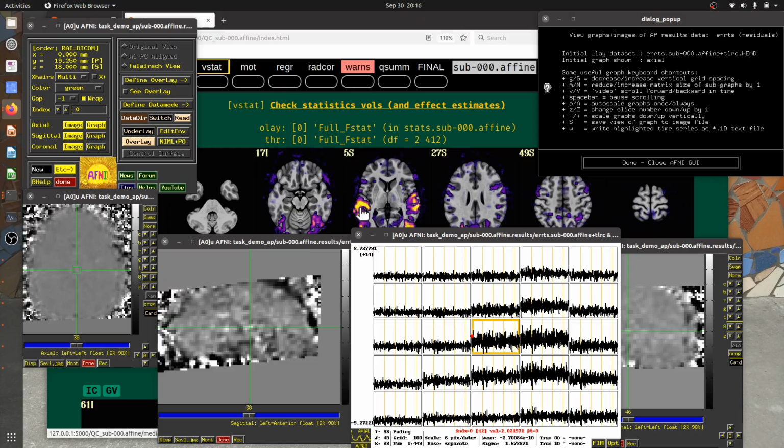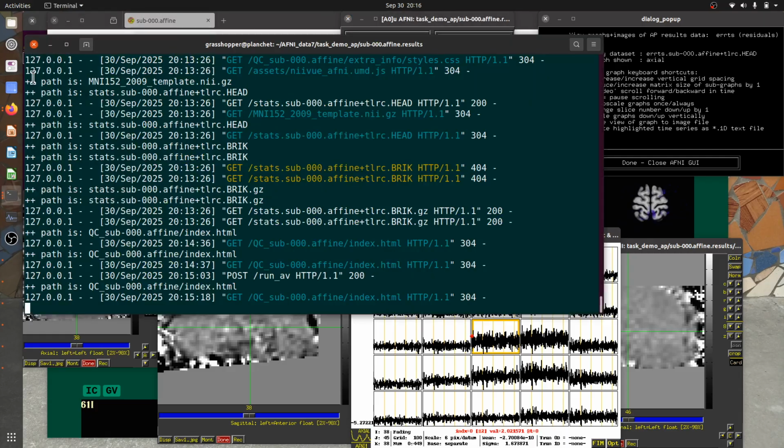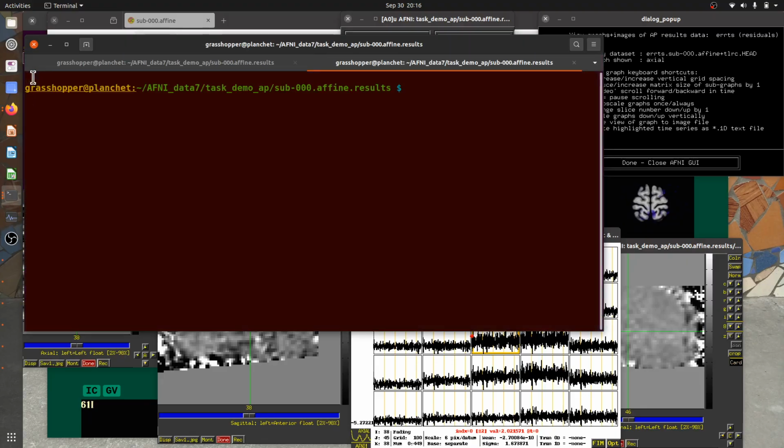So when we do our afni_proc processing, some of the last things that we get out are the residuals from the modeling, from our regress block modeling, as well as we can have the all_runs dataset and the fitts time series. So the fitts and the errts. And maybe I can jump to a terminal here and very quickly show these time series here.